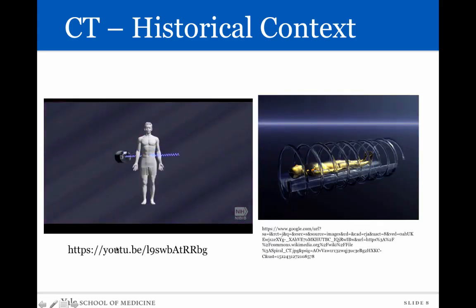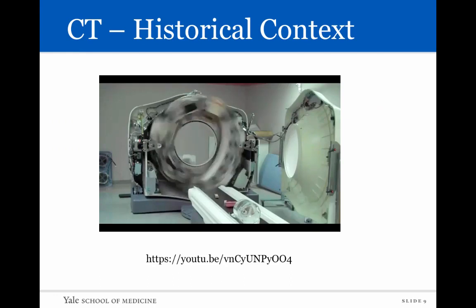You can see here the X-ray generator is beaming some X-rays. There's detectors on the other side, and the patient is moved through this X-ray generator as the generator itself and the detectors slice through the patient's abdomen, getting information about the patient's densities at all these different levels, feeding that into a computer. This is what a CT machine looks like.